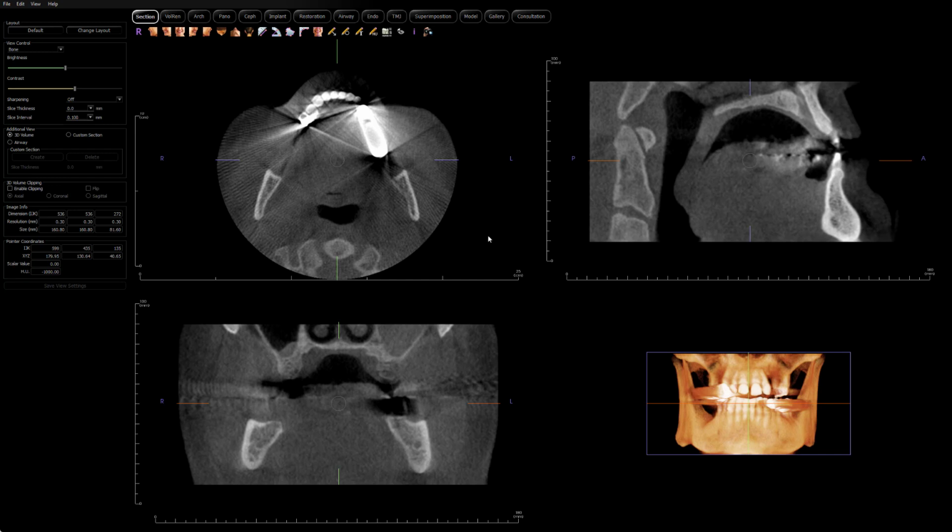All right, I'm going to show you how to anonymize in Anatomage Invivo and then create a file that can be viewed from any computer, even if someone doesn't have the software to view cone beam CTs. This file that you're going to create can be opened from pretty much any computer at this point. And then how to view that file from the executable file that we're going to create.